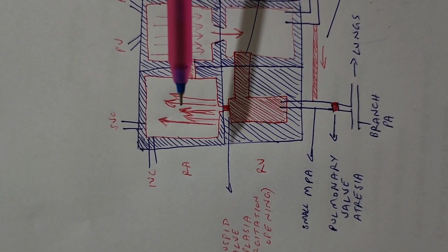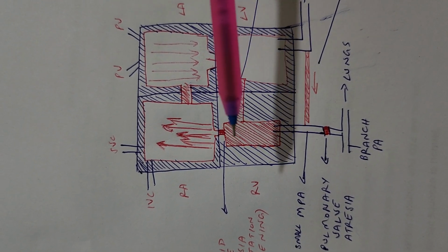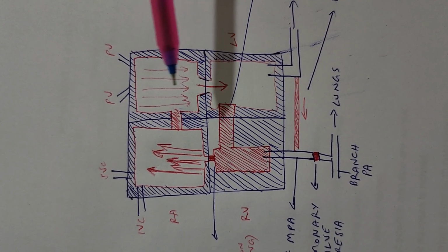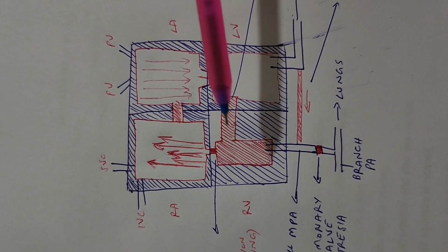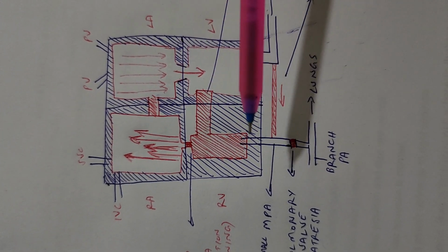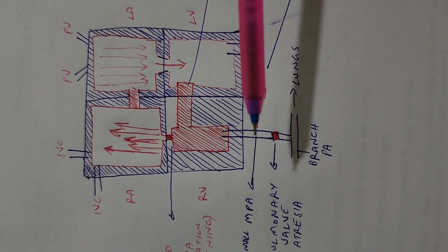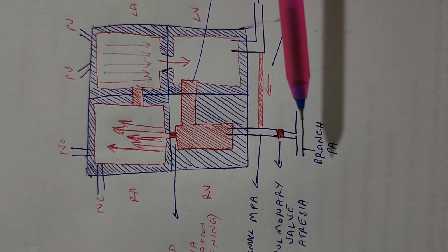That is what is shown here. As a result, less blood comes into RV. RV is extremely small. It is kept patent by the VSD. So blood from LA goes into LV across normal mitral valve and from LV into RV across the VSD, keeping the small RV patent. From RV you can see that there is a smaller pulmonary artery and the pulmonary valve is atretic. So there is no flow from RV into the pulmonary artery or into the branch pulmonary arteries.